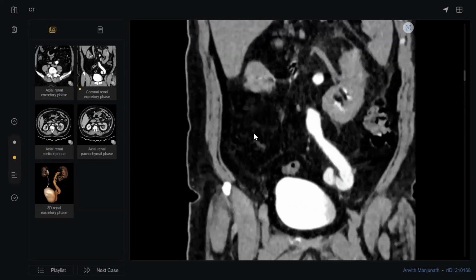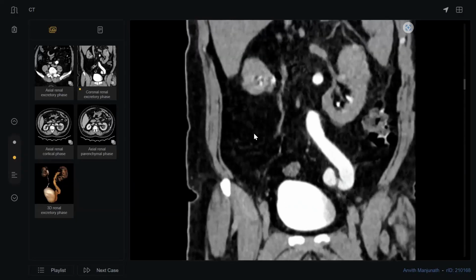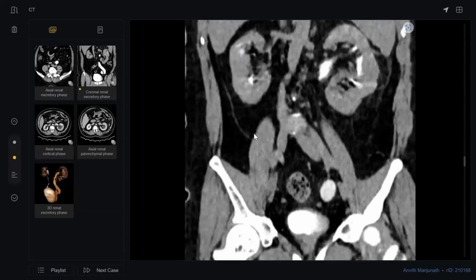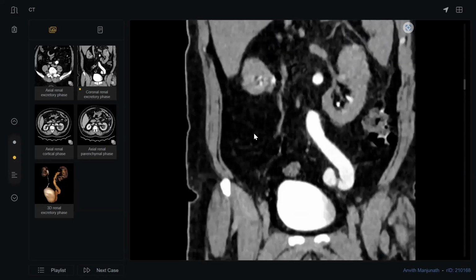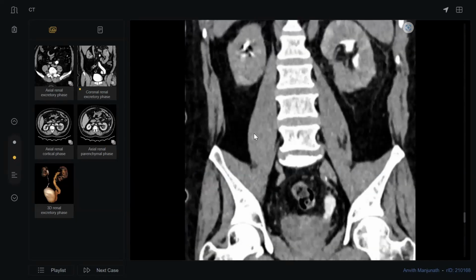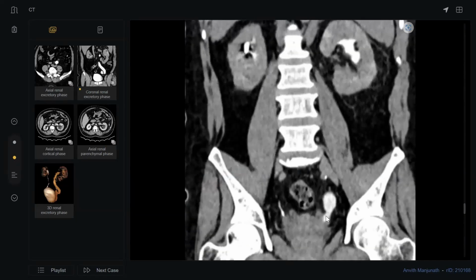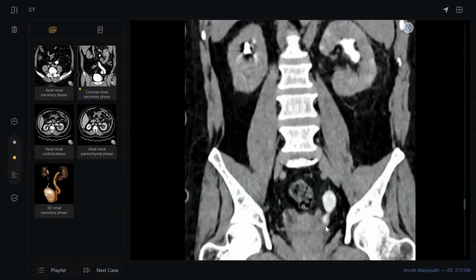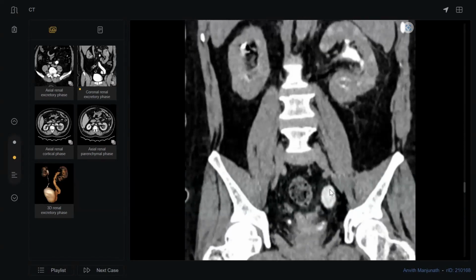This is a two ureters, one of them markedly dilated and connected with the upper moiety here. Okay, and this is the cause of pyelonephritis. And this ureter has ectopic insertion in the bladder, the upper moiety ureter. Okay, and here there is obstruction, the obstruction here.